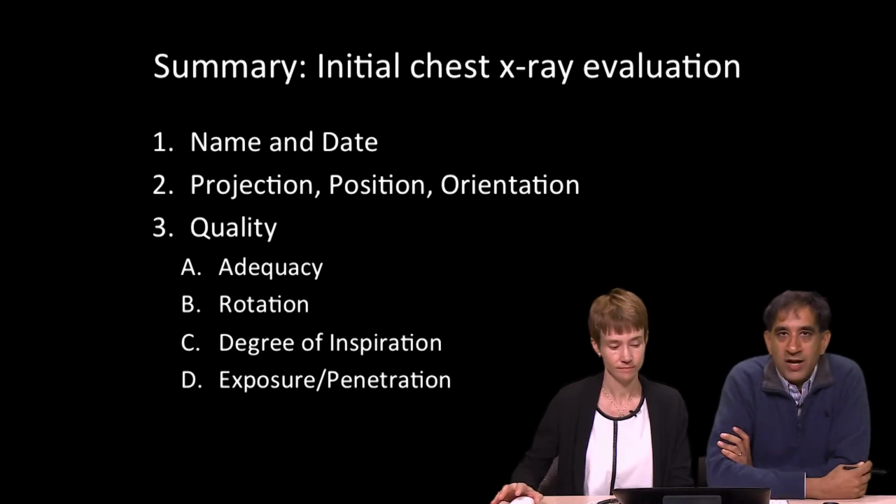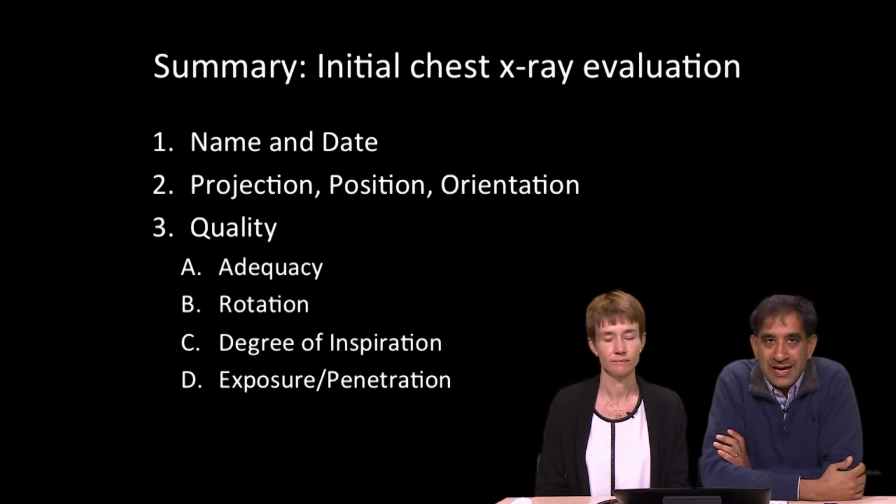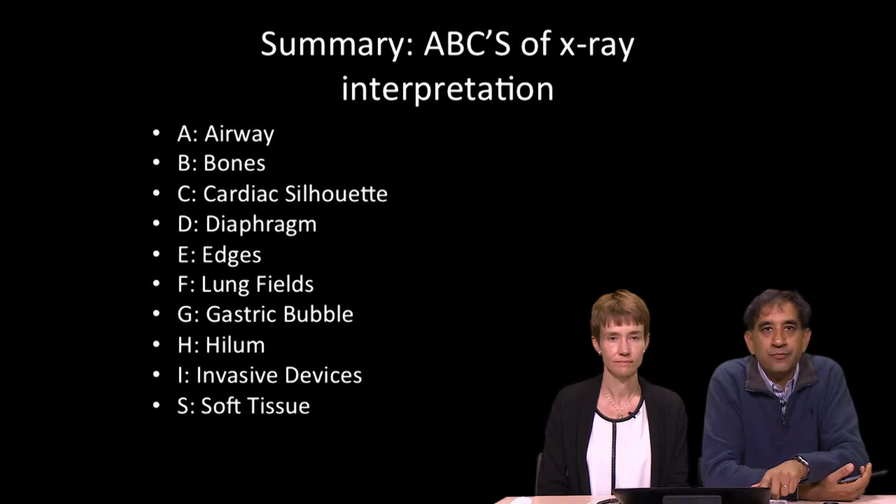So to summarize, when we're doing our initial chest x-ray evaluation, we want to make sure it's the right patient's name, the correct date. We're going to look at the projection, position, and orientation, and then evaluate the quality of the film: the adequacy, rotation, degree of inspiration, and then exposure and penetration.